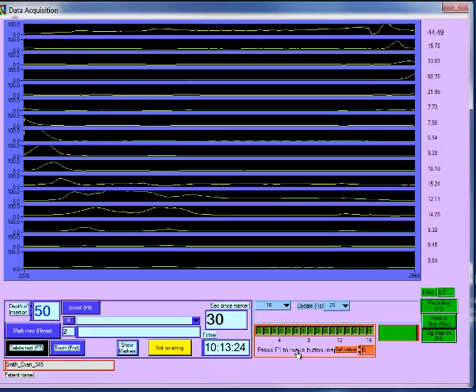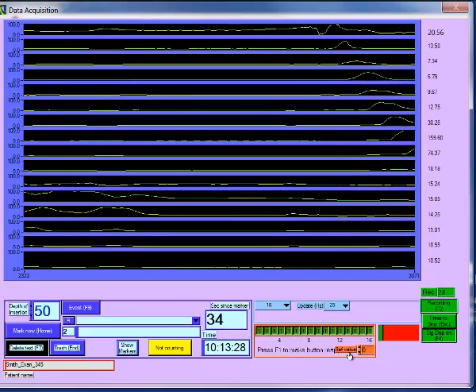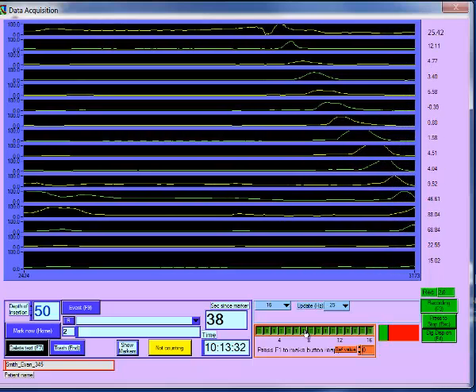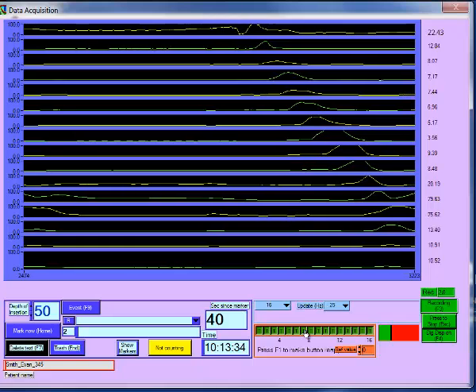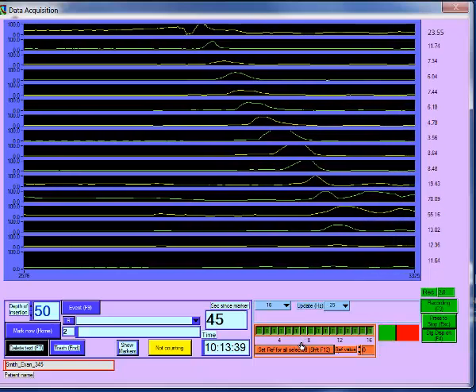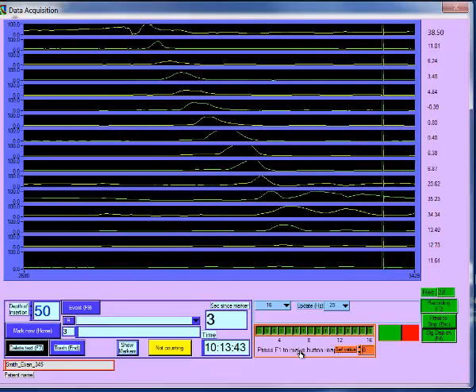Generally, you will not need to adjust the reference values or the channels to reference. If you need to repeat the process, press on F1 to make the button reappear, and you can then press it to reference again.